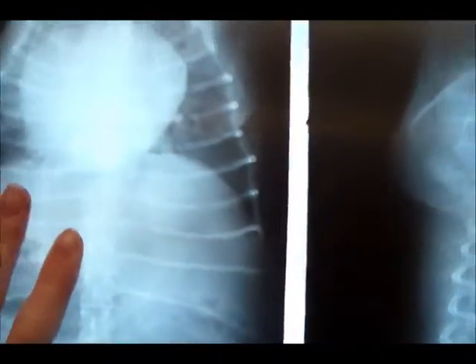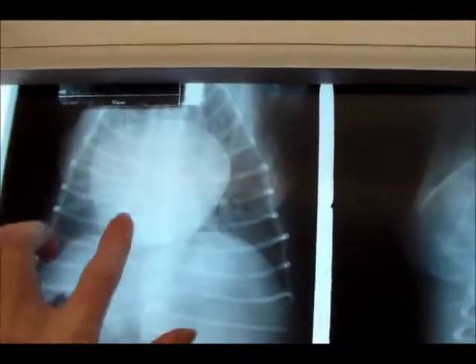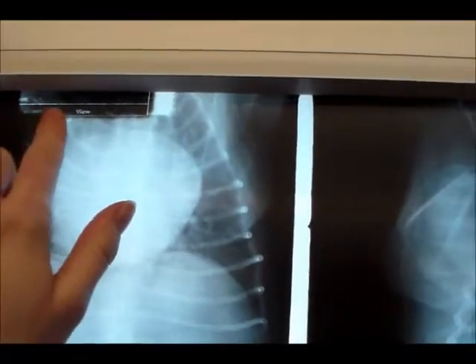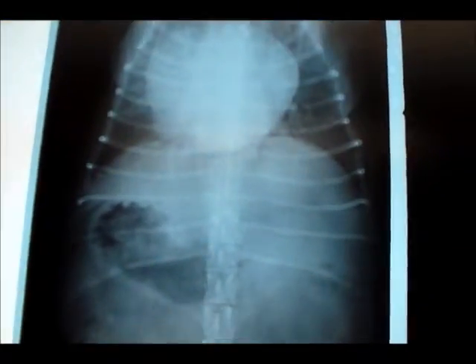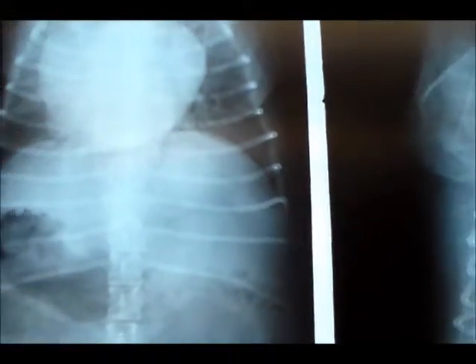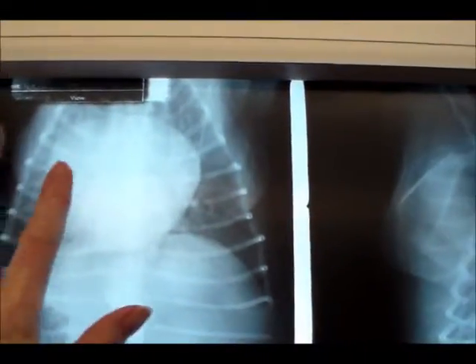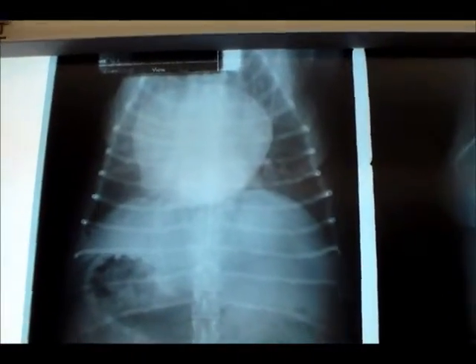And I have a VD thoracic. Actually, pretty much a whole body. But it was labeled as, they took it to see the chest. Very large heart. But here's your label here. All the letters are going the right way. That's the way they did it back then for as far as knowing what position. They wrote it down as VD, so we know that this is the patient's right side, this would be the patient's left side. So this is your thoracic VD.